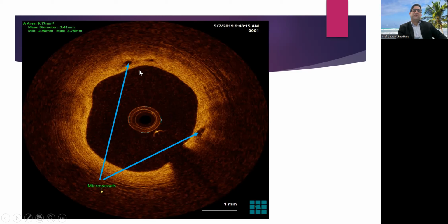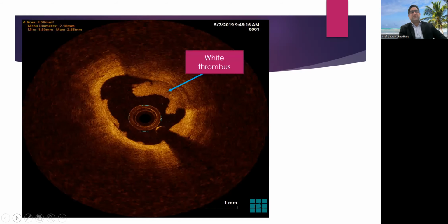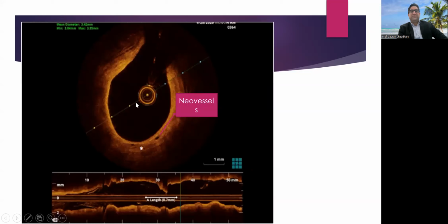This lacuna, a dark shadow structure that is circular, can be seen in the intima media, and this is a neovascularization of the atheroma. And again, a white thrombus is echo bright with less attenuation. So it is a smooth bright structure, that is, it is white thrombus, and it can be differentiated from the red thrombus, because in red thrombus there would be high attenuation behind this margin. This margin would be bright, and behind this there would be a dark shadow. That means there is more attenuation. And when the structure is bright and less attenuating, then it is mainly composed of white thrombus.